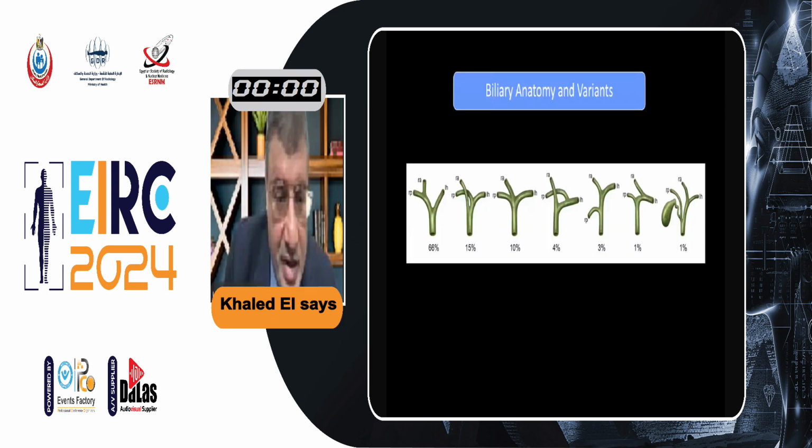Moving to the biliary anatomy and the variants, which is also very important. So this is the classic anatomy. Same thing. This is the main common hepatic duct. This is the left hepatic duct. This is the right, and the right is dividing into right posterior and right anterior. Several variants here, and again they account for about 34% of the cases. Mentioning some examples of them.